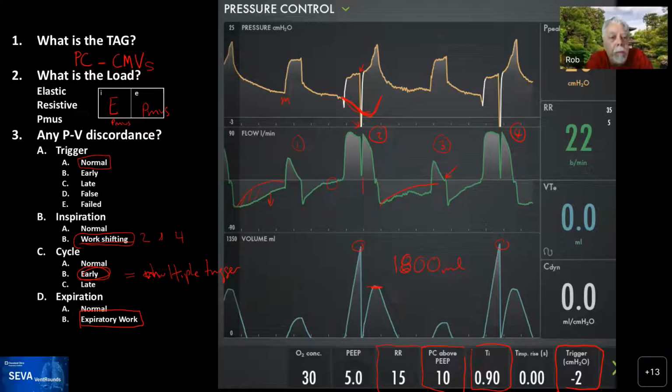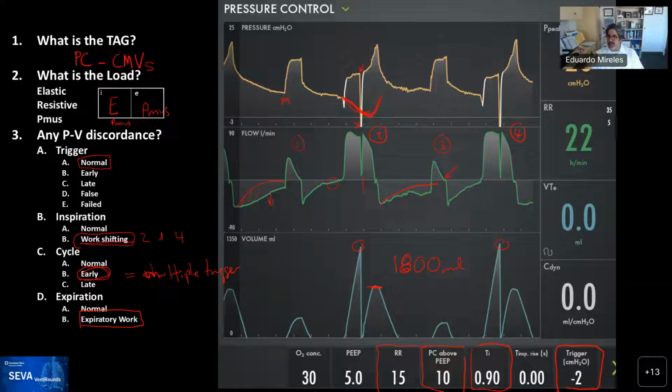Right. And this is actually a really good comment because it also makes you think about all these trials that we do in which we're focusing on tidal volume and you're charting, or you're looking at the records that are coming from the ventilator. Unless you had the ability to see the waveforms, the highest tidal volume that you would record would be 1300 or 1200, when in reality it's close to 1800.